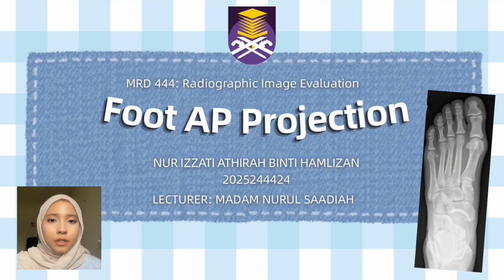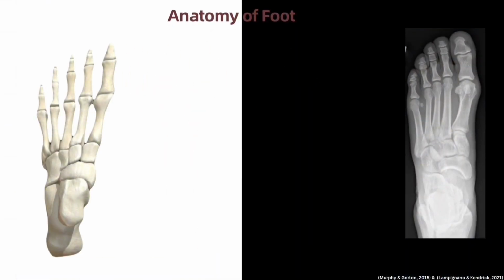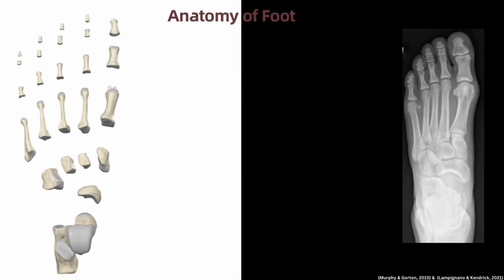So today I am going to present image evaluation of foot AP projection. So first, let's start with the anatomy of the foot. So here we have the bones of the foot and the radiograph of a foot.